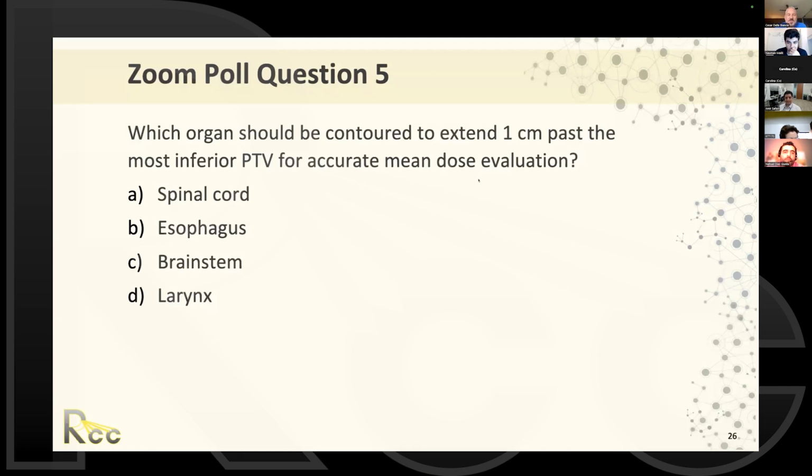I mean, for the 50% isodose, in head and neck in particular, we want it to be as conformal as possible, following the shape of the PTVs. But for IMRT cases, actually at 50% you might start having some streaking, especially in the area of the parotids or the oral cavity, which are organs that we spare with mean dose.